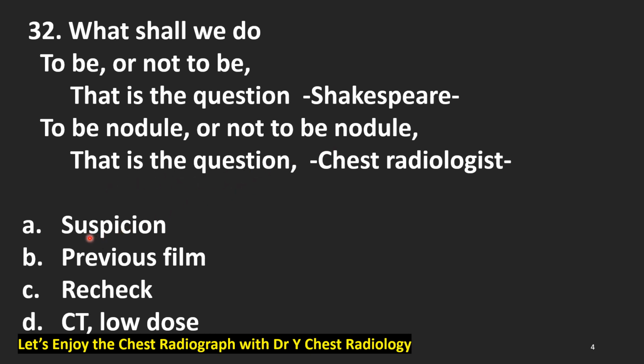First, we have to have a suspicious mind about the possibility of nodule, possibility of malignancy, and then compare with previous films. If not solved, we'd better recheck another film, another same film. Still in darkness, then we have to go to CT, chest CT, possibly low-dose chest CT.